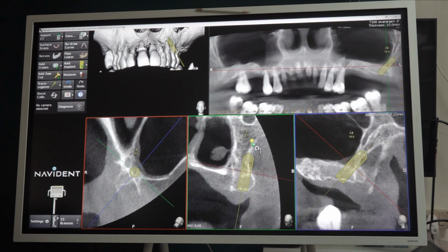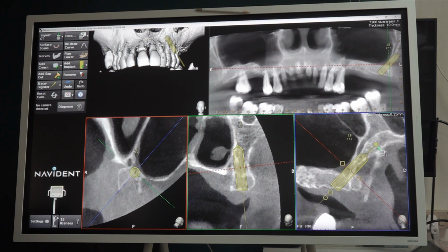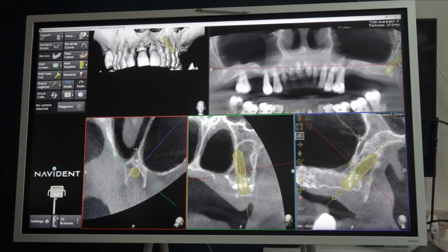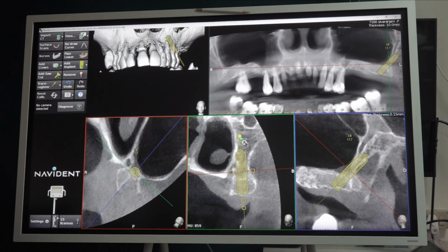If you tilt buccally, you will go like this; buccally perfect and come. So towards the midline you have to tilt, distally also the correct tilt. Apart from that, you have to start from the correct point. If you do all the correct tilting but start more anteriorly, you will be in the sinus. If you do all the tilting correct but start very much distally, you will go into the pterygoid space, soft tissue. So only if you start from the correct point will you enter the good bone.